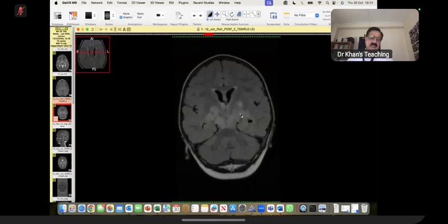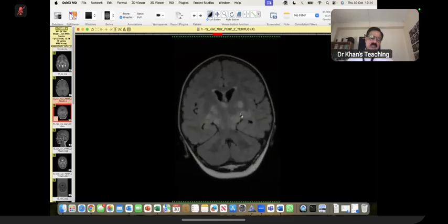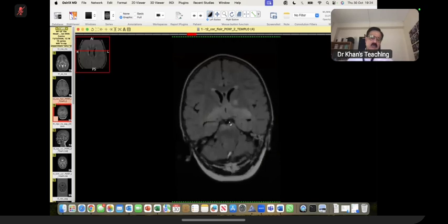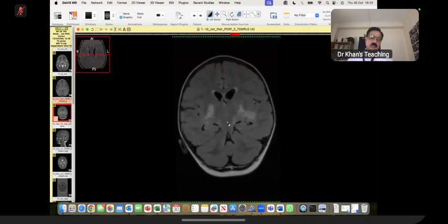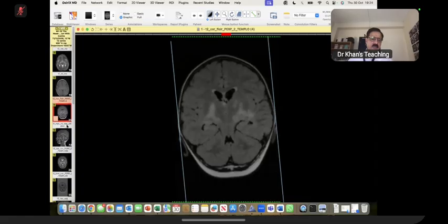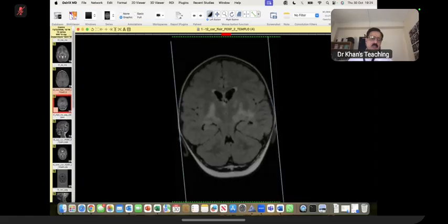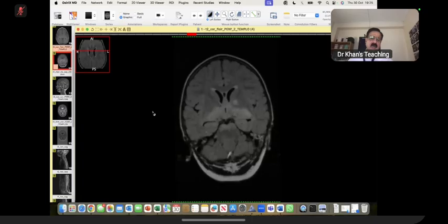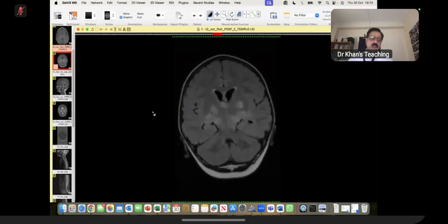If a lesion is there which is not explainable, which is not in continuity with the parent tumor, then for example, this one can be a focal area of signal intensity, which we can see in NF1 cases. Now, I showed you other than that contrast. Please remember that optic nerve glioma are low grade 1 tumors, so they might or might not enhance. Enhancement will not change the diagnosis.